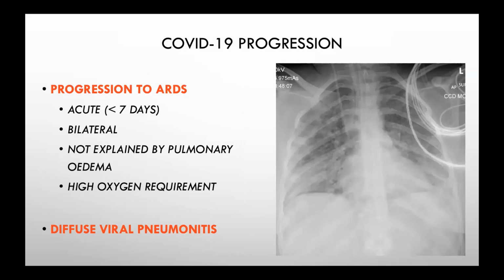And this is what it tends to progress to. So we were talking about the ground glass that you sometimes see. And this is that ground glass pattern, which is just really sandy, thin glass type substance that you can see on an X-ray. It doesn't look like extensive consolidation, but just looks hazy throughout.